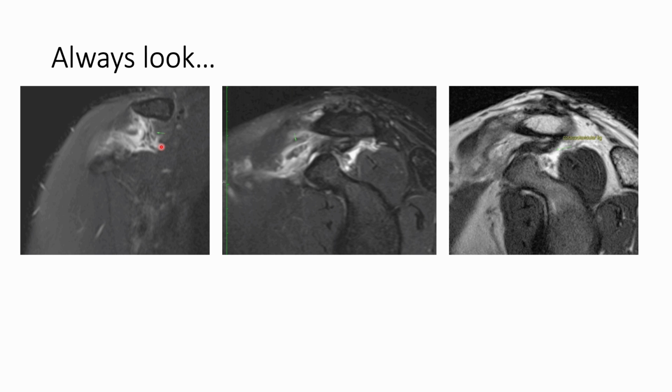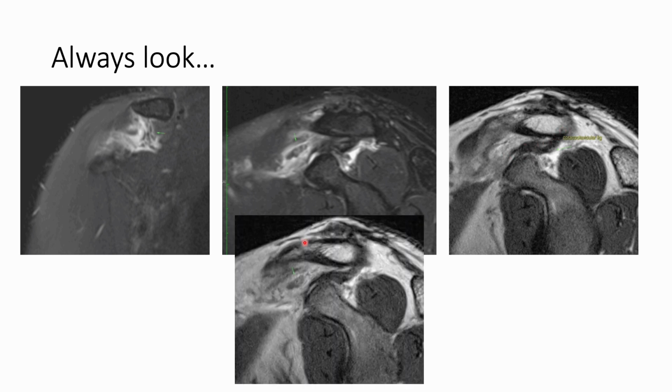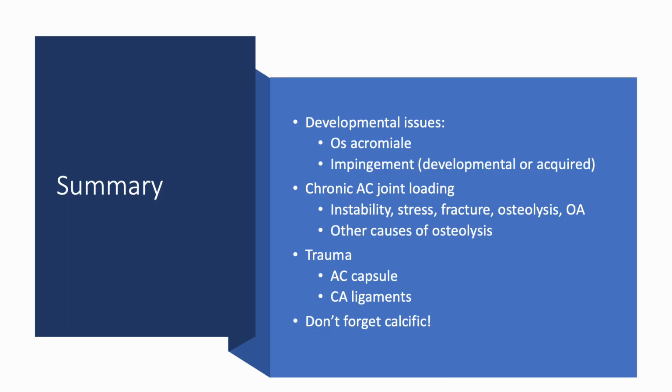And we were very quick to think that maybe this is an injury to this coracoacromial ligament. But when we talked to the patient, there was not much injury and the AC joint looked relatively good. When we look on the non-FATSAT images, we can see very nice coracoacromial ligaments, right? And so this patient, we looked at very closely, this was actually a hypointense focus here, and this was calcific periarthritis that was sitting next to the coracoacromial ligament or along the anterior aspect of the coracoid process.